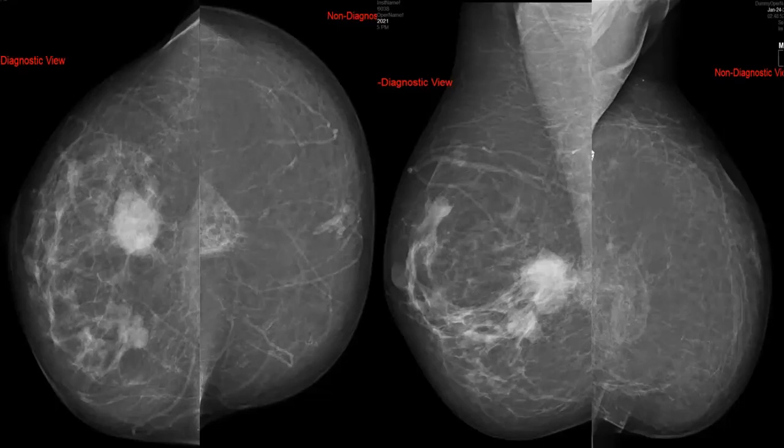There is calcification high up. If I told you this patient had a history of left breast cancer 17 years before, it could be a local recurrence of the breast cancer with mets to the contralateral breast.